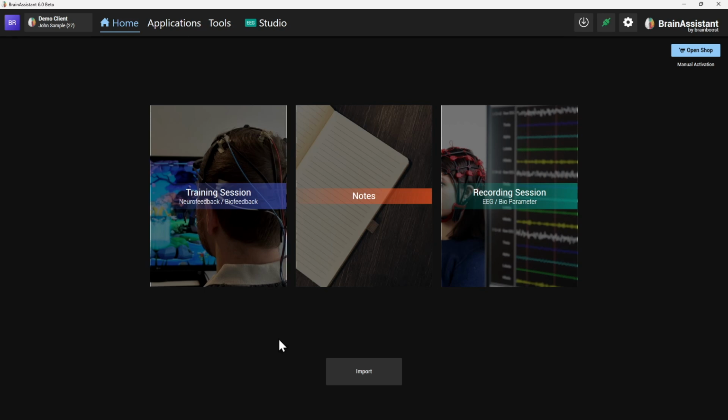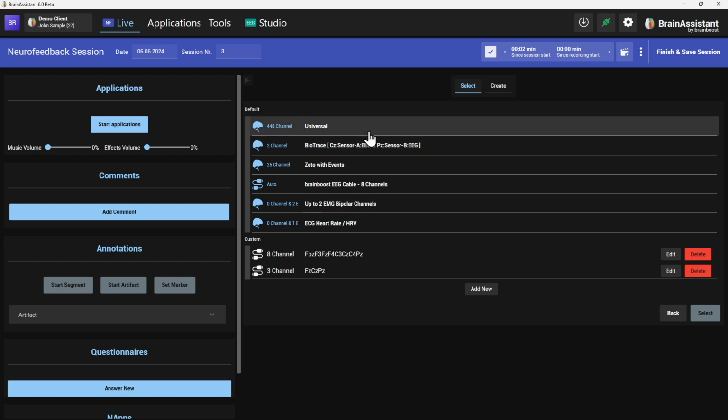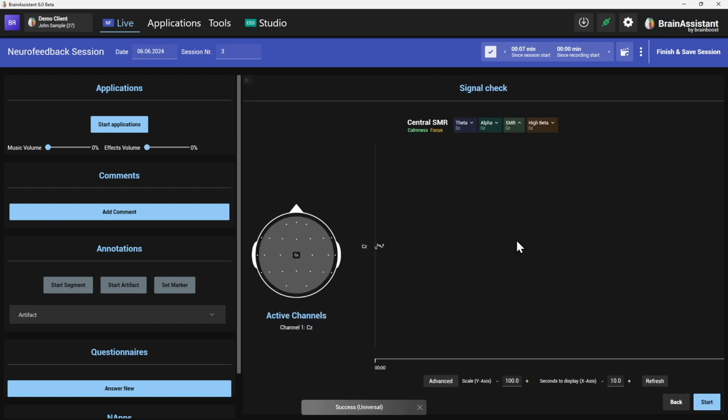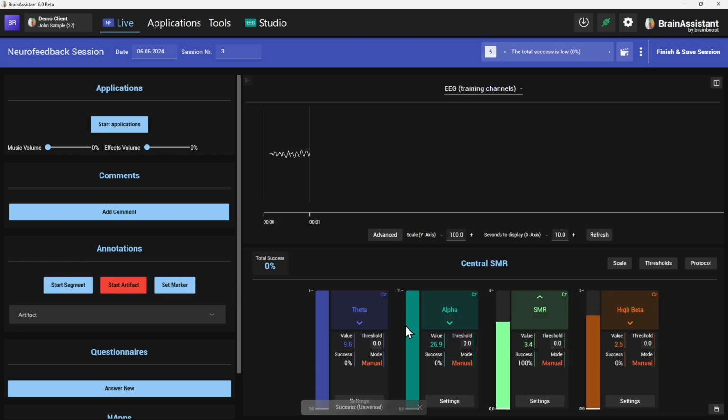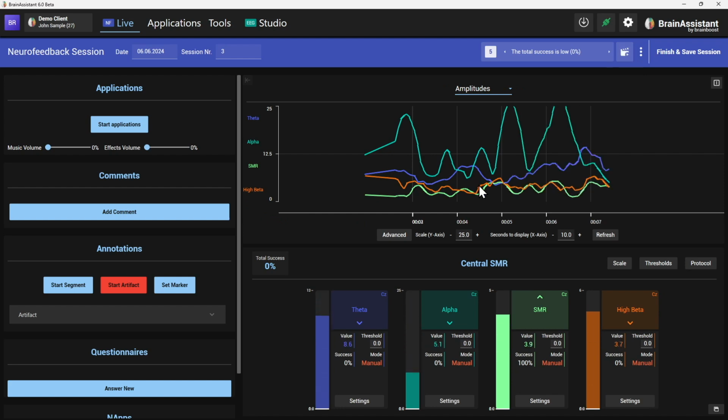And Linda, the training session, you can then start, and if you have BioTrace running, it will skip all these parts because we have a protocol. Also this, you cannot select. It will end up at this, because we get up to 4. And here, yes, you can start a flow, but you will only have this as a recording.